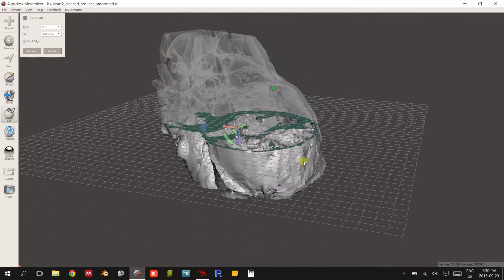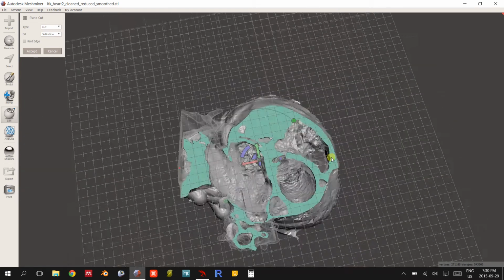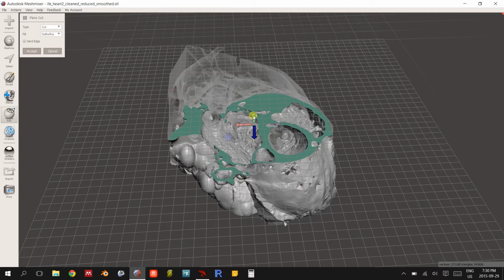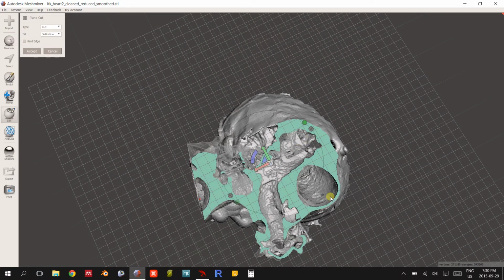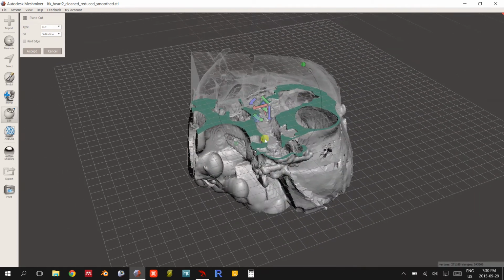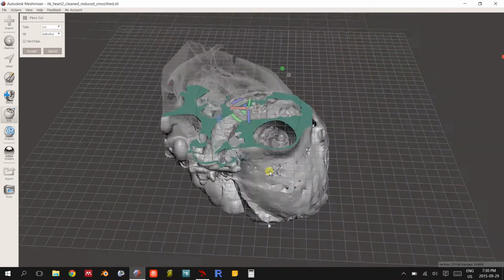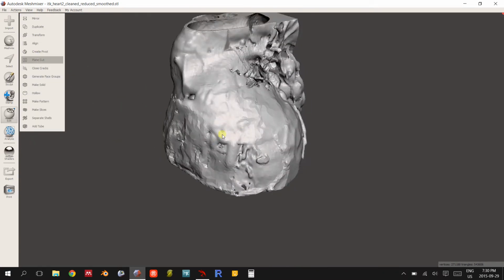As we move up towards the atria, let's start to see the formations of the right atria here and the left atria here. And again, the aortic arch is very well defined. As we keep moving up, it becomes even more defined, as you can see here, and I think that's the pulmonary vasculature as well. And if you want to see the four-chamber view, I think I can give you that.